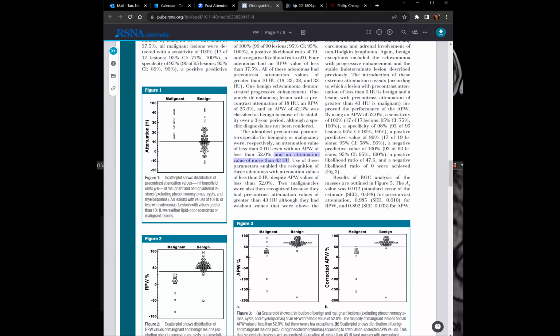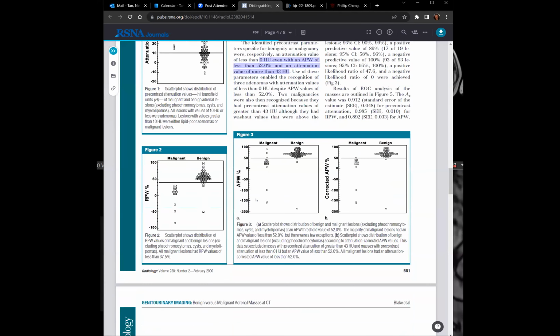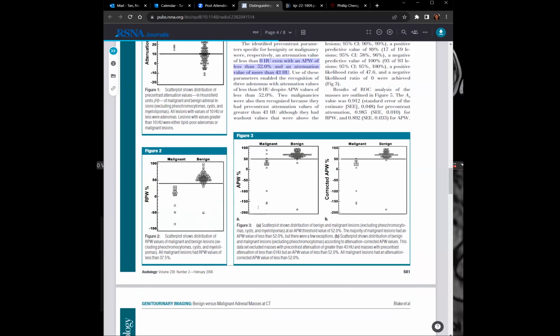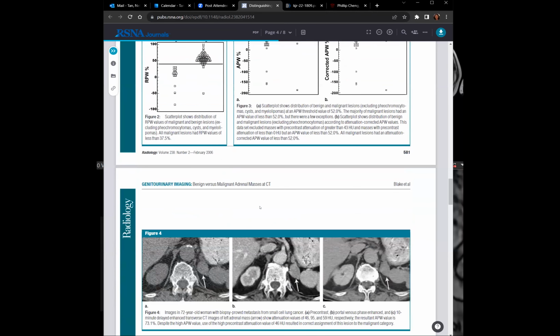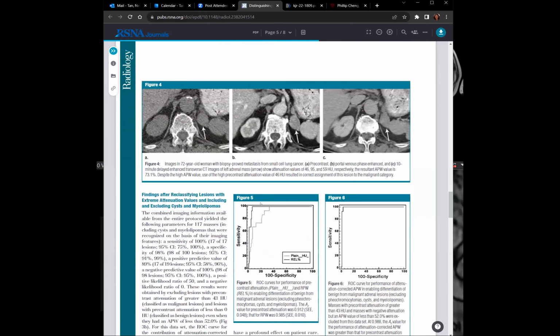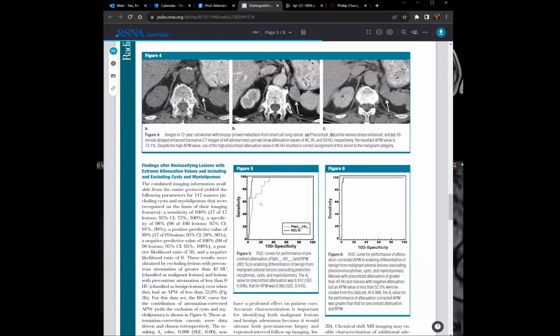And I don't know what to do for this case. Endocrine's been following it. Like I said, urine studies were negative. So they've just been following it, but I think pre-con it's still pretty suspicious for a pheo, even if the urine is negative. It doesn't mean it has to be resected or that it's a hormonally active pheo, but it's T2 bright, it's got washout, it was dense. I think pheo is still in the differential. If they're concerned, they could do a DOTATATE and see if it lights up on that, which now people are using more than MIBG, I believe.